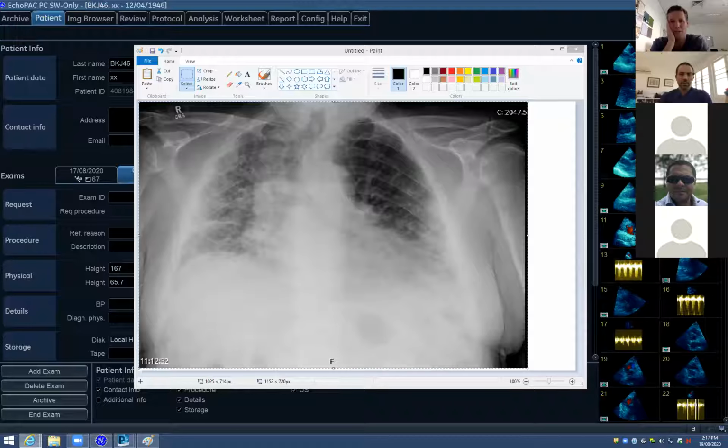And this was his chest x-ray when he came into hospital about 2 weeks ago, showing what was thought to be a fibrotic lung process, with the CT scan showing some interstitial fibrosis-like pictures, some contractures particularly in the right upper areas.